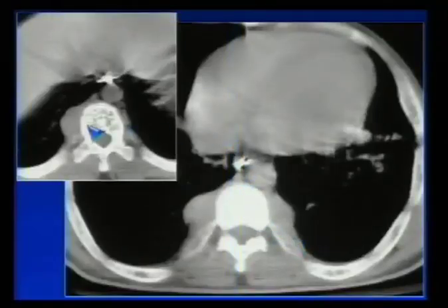Okay, so what do we see on the CT scan? We see paraspinal masses, and they're bilateral. So differential diagnosis, neurogenic tumor for posterior mediastinal mass, such as ganglioneuroma or neurofibroma. But look at the expansion of the ribs. Look how expanded these are. So if you see that, you can throw in extramedullary hematopoiesis because that is in the differential diagnosis for posterior mediastinal mass.